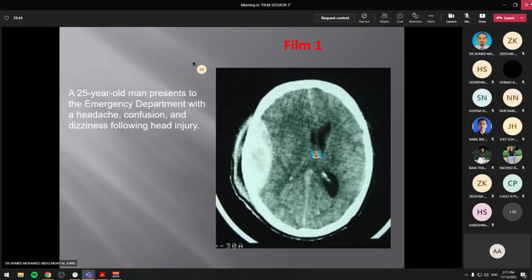Okay, then this is number what? Number 4 or what? The point under description. If it is number 5, we check for any other focal brain lesion, like a mass, like a nodule, like a bleed in another area. If nothing there, in a trauma case I also have to look at the scalp. If there is any scalp hematoma, like this one, there is a scalp hematoma. So this is number 6. You look for scalp hematoma. Okay, this is how we describe it.